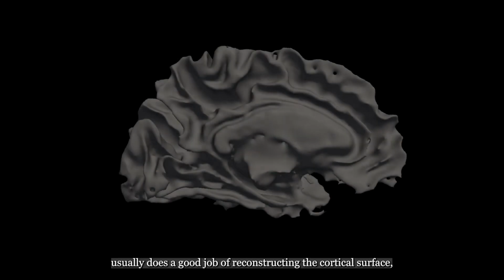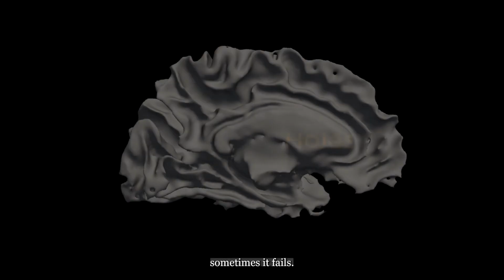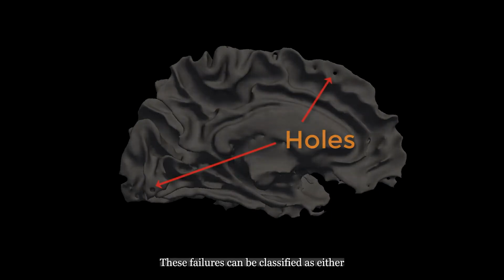Although Recon-All usually does a good job of reconstructing the cortical surface, sometimes it fails. These failures can be classified as either hard failures or soft failures.